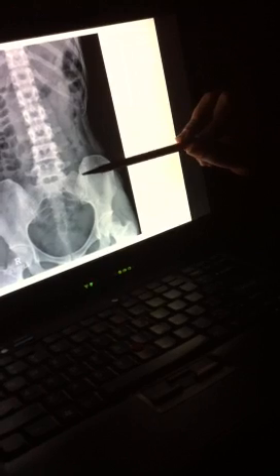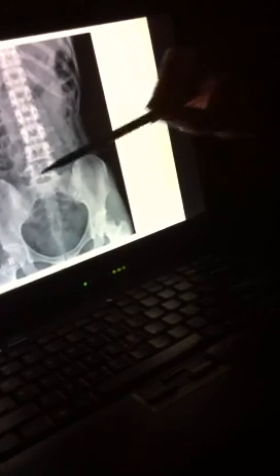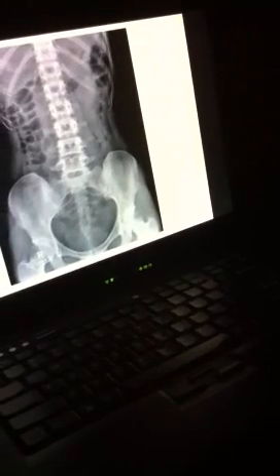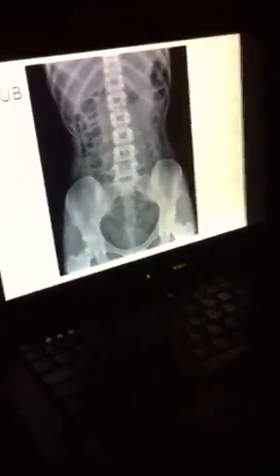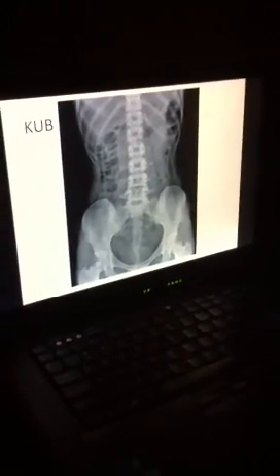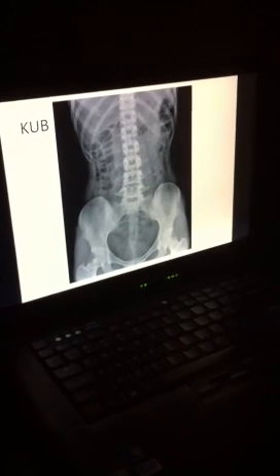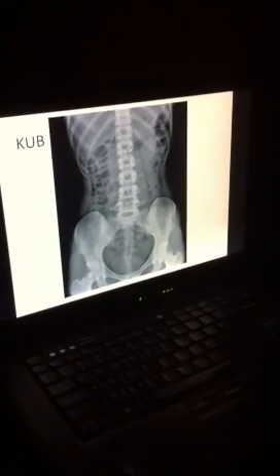What is this right here? And there's one right here. The gonadal arteries? Uterine tube? Don't forget, this is an x-ray. It's the sacroiliac joint or the iliosacral joint. Call it either one.